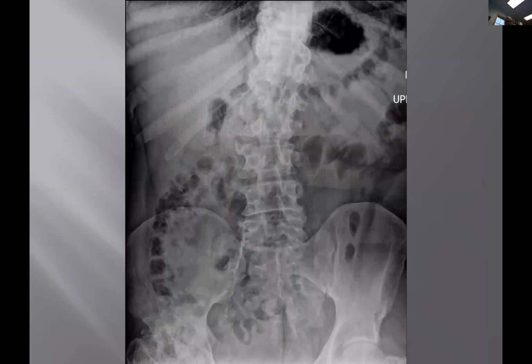50-year-old with a motor vehicle accident and rib pain. All right, this one I need to go quickly through so I can get to the other cases for the quiz, okay? So let's not spend a lot of time on this one. But, all right, this is a Where's Waldo case. I'm going to make you make 2 findings. So unmute yourself and make the findings. Don't get search satisfaction. Look at all corners of the films. And let me remind you, there's rib pain. All right, go for it. Tell me where the 2 big findings are. As soon as you get it, we'll move on.